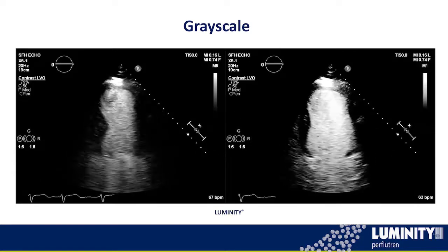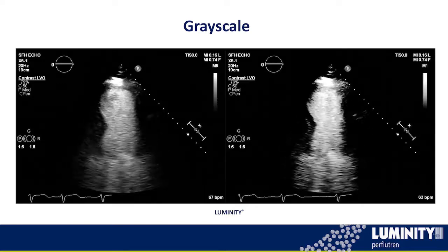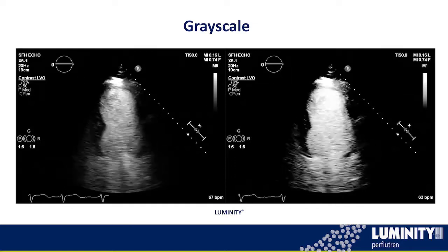Again, this is going to be different to your eye. You might like a gray map that's a little smoother rather than more whites, kind of more black and white. Again, you might not find this necessary to change, but in certain systems with certain transducers, this may make a big difference when looking at volumes.